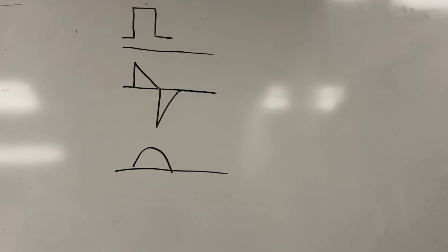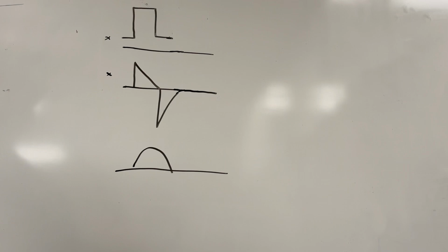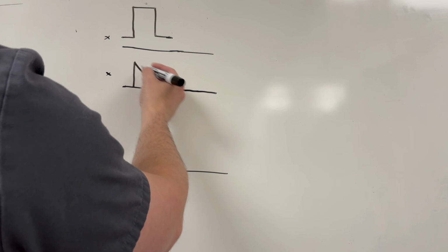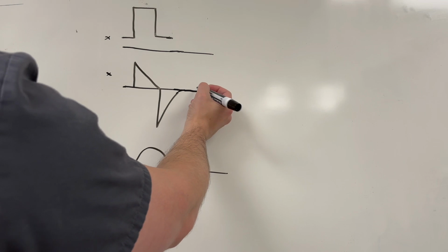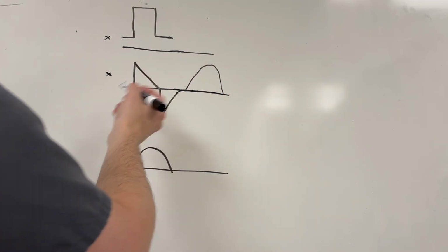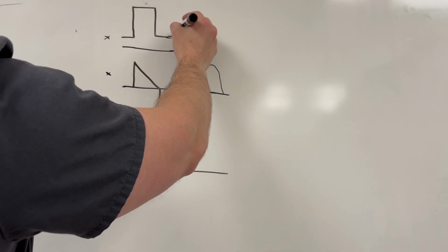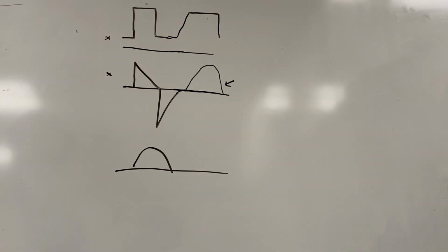If your rise time is set too slow, you're also going to see it on the flow waveform and potentially the pressure waveform. So in your flow waveform, instead of again seeing it going straight up and then decelerating down, because it's too slow, the flow rate isn't fast enough, we're not going to move straight up. You're going to move at a more slanted direction before coming over this way. And on your pressure waveform, you can see it kind of the same thing, where instead of coming straight up, it'll lean a little bit this way before it hits its pressure and holds. I remember this by thinking of it as almost like a shark fin.